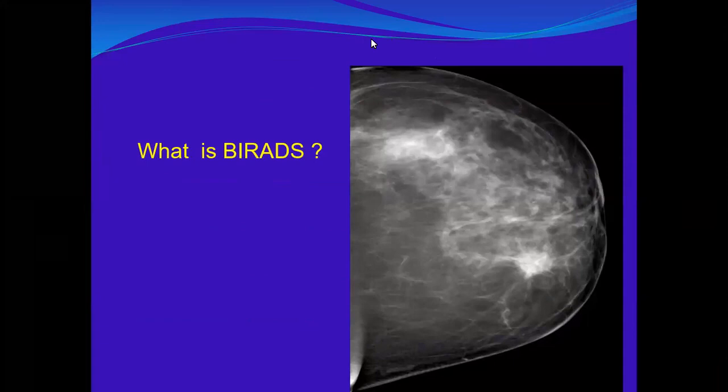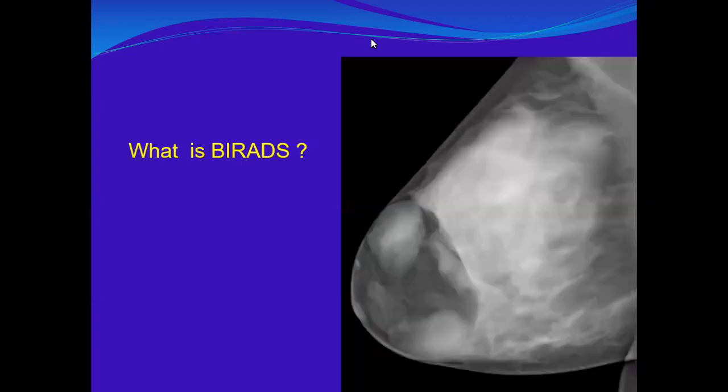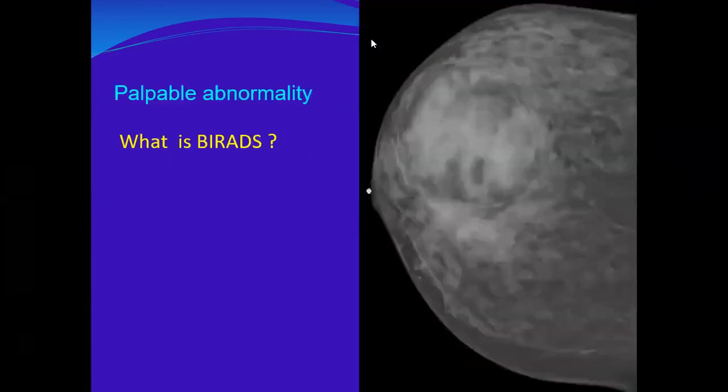What is BI-RADS here? Quickly. BI-RADS 5. Why? Quickly, tell me. This is a spiculated mass, representing BI-RADS 5. And this one? A fat-containing, mixed density mass, hamartoma. Yes, BI-RADS 2. Okay. And this? Another fat-containing mass, BI-RADS 2, hamartoma again.